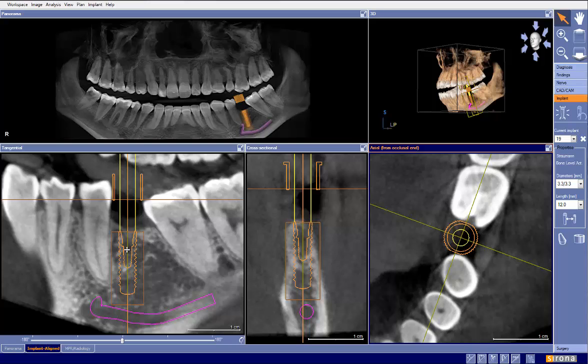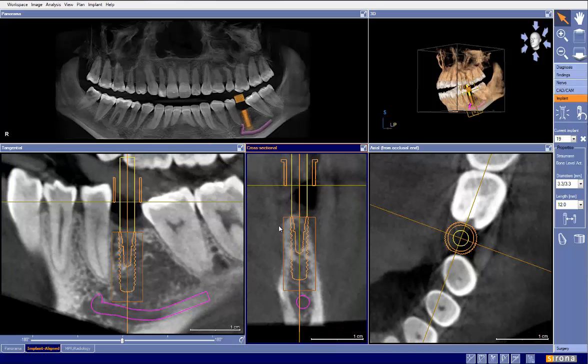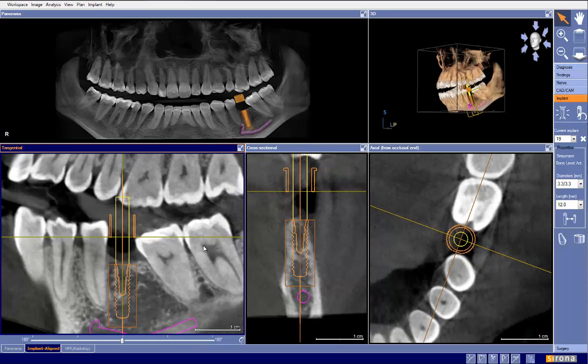So, honestly, if I were going to adjust the mesial of 19, I would go ahead and move the implant over just a hair like this and adjust the mesial of 19 a little bit more. But I would be prepared to graft this site. Personally, I would use a different implant, an implant that will expand and give me more stability, allow me to do a little bit smaller osteotomy diameter, expand the bone. But again, the Straumann implant is a very good implant and it certainly will work in this situation. Just need to be prepared to graft about 5 or 6 threads in this particular case.